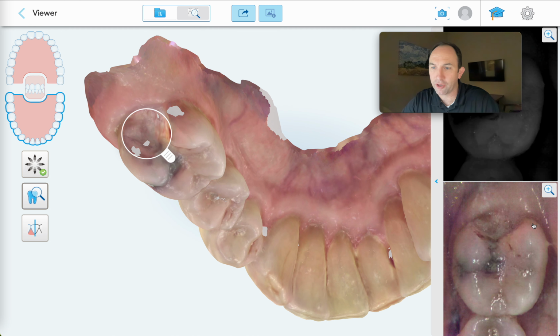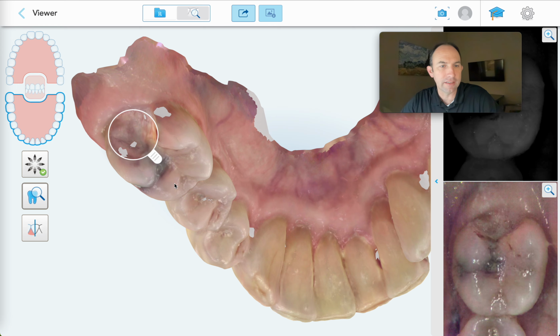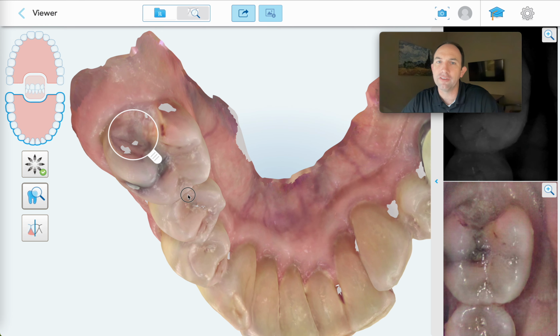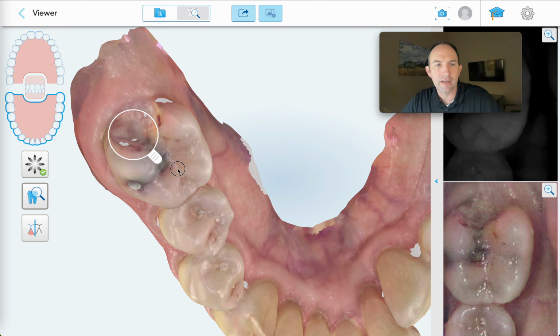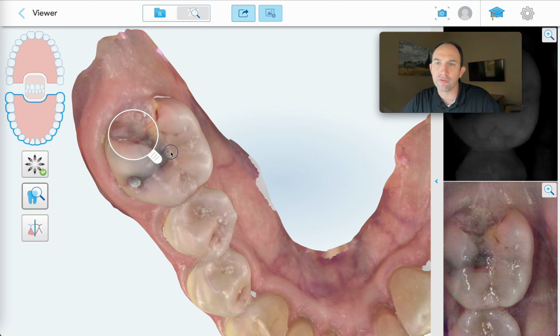Now the question mark is how deep down to the bone, or in relation to the bone, that tooth decay is. A lot of times the cavity will go subgingivally and we can still save the tooth, but once it reaches the level of the bone, unless we want to talk about some sort of crown lengthening procedure, in certain situations the tooth is no longer restorable.